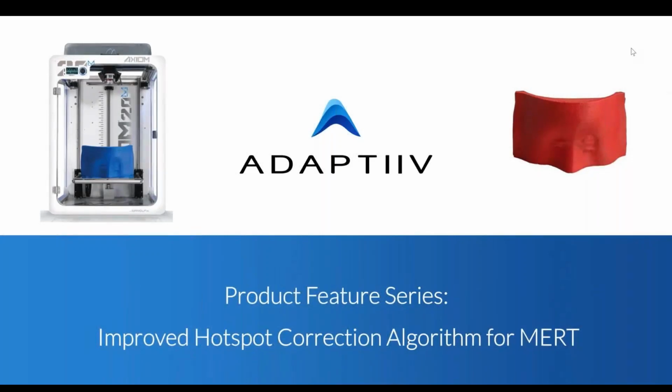We have a special presenter today who I'll introduce a little later from our team here at Adaptiiv, one of our medical physics specialists, who is going to walk you through the modulated electron bolus module in our software and how it can drastically improve and reduce hotspots for radiotherapy.